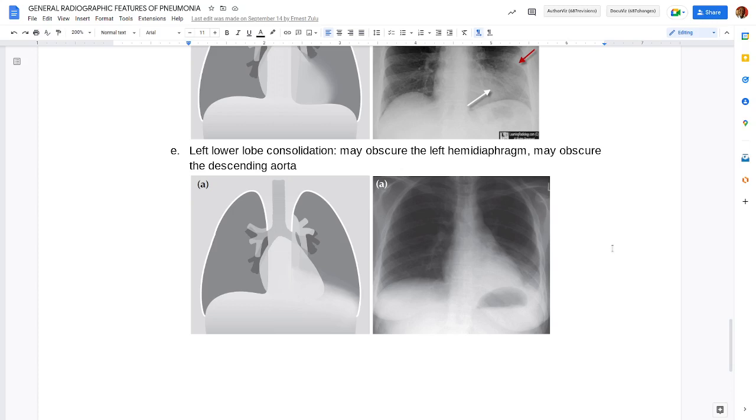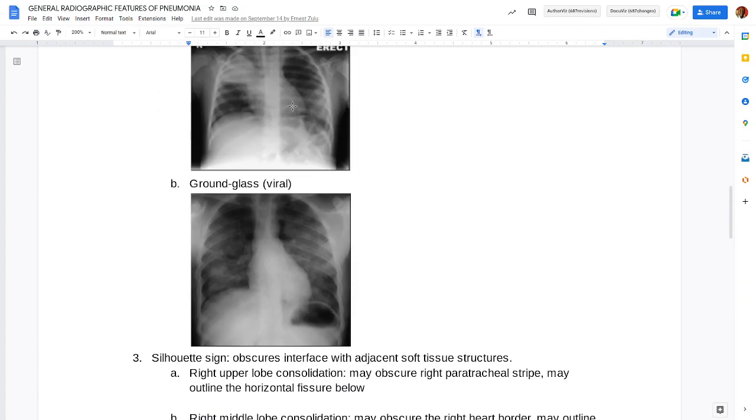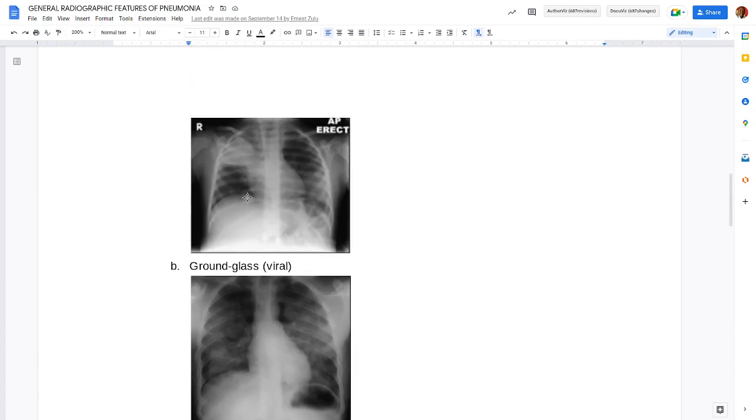But it turns out, for something like this, the way the AI model would work is similar to how you would operate when you work on these images over and over again. If somebody just shows you an image like this, you'd be able to know what sort of affliction, what pathology this is.